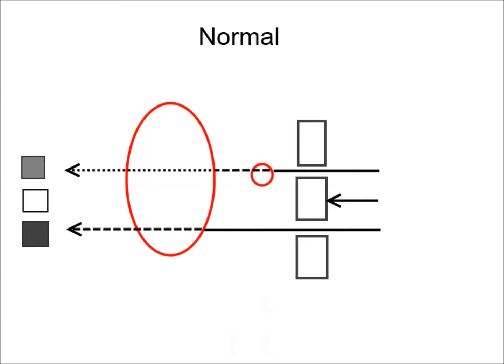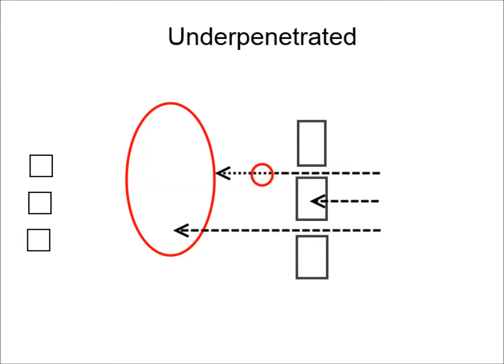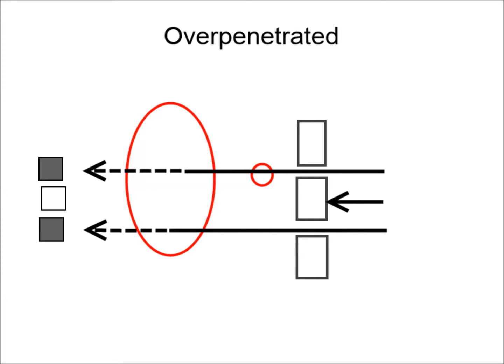This diagram shows how the X-rays travel through these structures, with the heart on the left, a pulmonary vessel in the middle, and the spine on the right. In an under-penetrated film, the weak X-rays fail to penetrate even the soft tissue of the heart, meaning the heart appears just as white as bone. In an over-penetrated film, the powerful X-rays go straight through the small, soft pulmonary vessels as if they weren't even there, making them invisible, while the heart appears darker than it should.